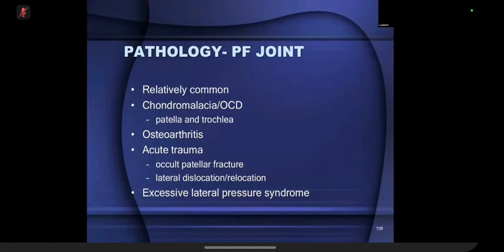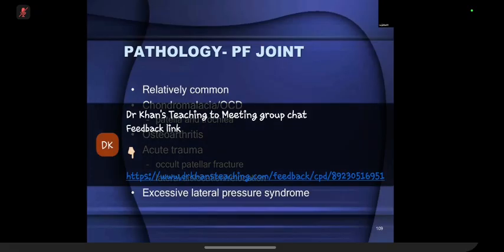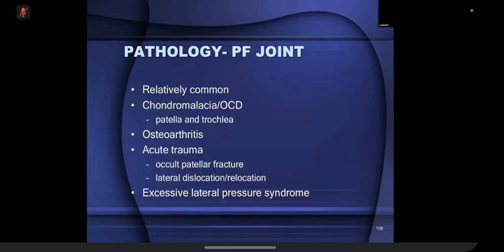They identify that the cartilage is soft, you can easily probe it, it's looking blue and horrible. And when they see the MR report, we've said that we can't see anything wrong with the cartilage because it's smooth. MR tends to undercall it. So remember that with chondromalacia in the patellofemoral joint, you have to carefully look for it. I'll show you what you need to see.